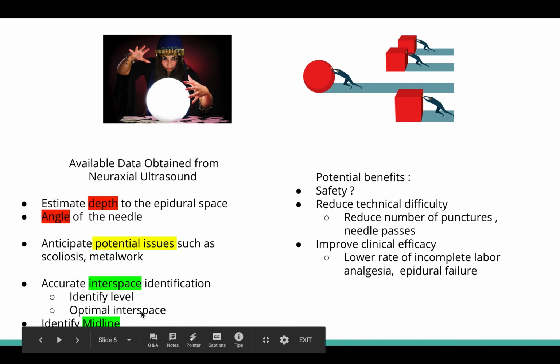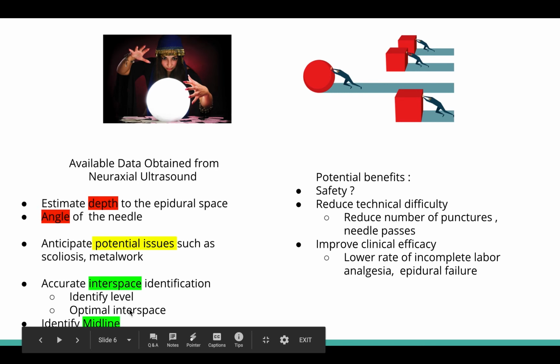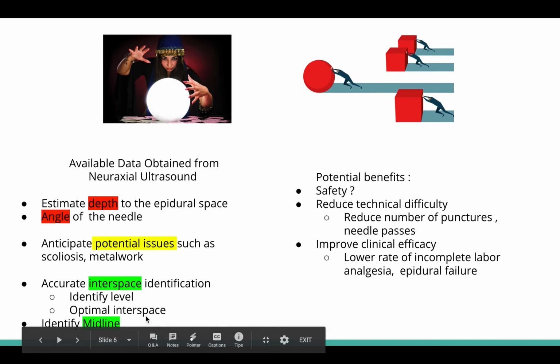And then also the L5-S1 interspace is a pretty large space and actually pretty good for spinal epidural, but it can be difficult to palpate. So if you're not able to palpate it with the traditional technique, you may skip this valuable space. And lastly, identifying midline, which sounds like a very simple task, but I'm sure in some patients that you encounter, it's simple, but it's not easy.